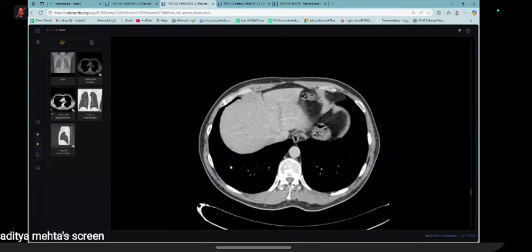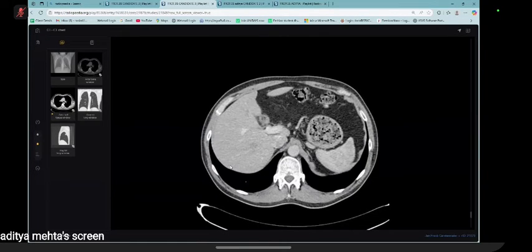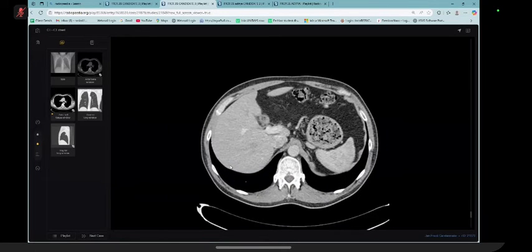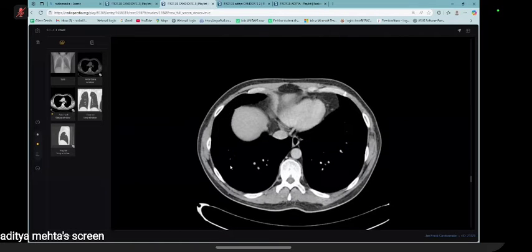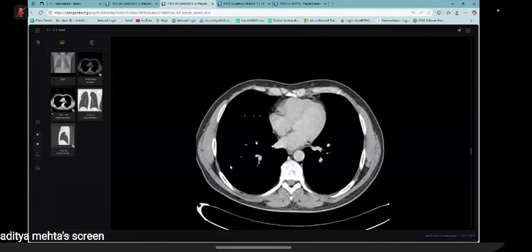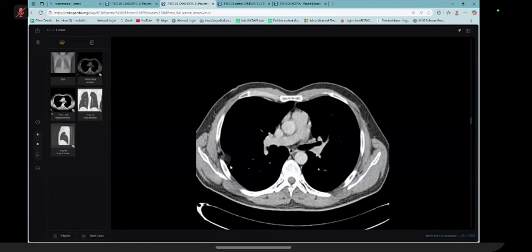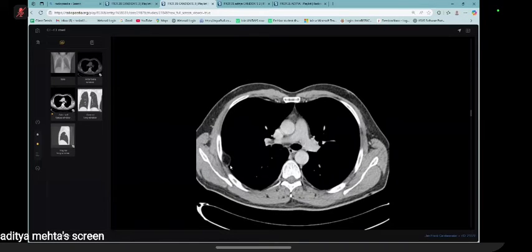It's only for the chest and the upper abdomen. I couldn't see anything in the upper abdomen. So I will go back to this lesion. It's only this well-defined hypodense lesion with fat content. I believe it's fat content because it's low density.